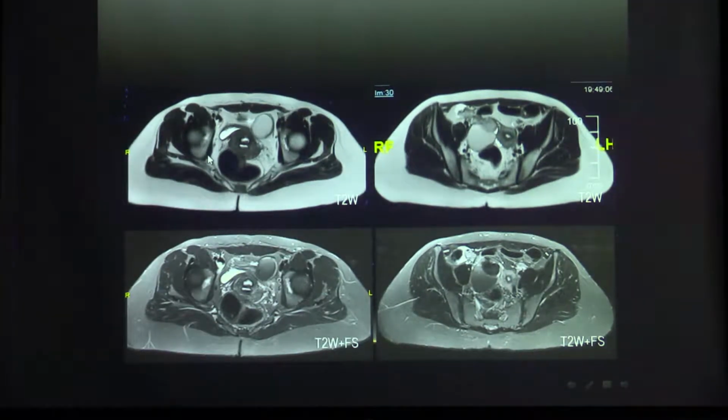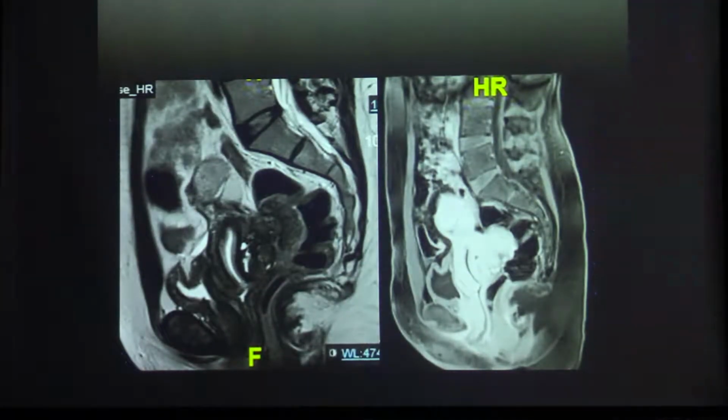We can see the endometriotic implant here. We're about to see a better picture of it. Note the high signal lesion in the posterior myometrium. We will get to it later. Those are sagittal views of the T2 sequences. Here we can see very clearly the endometriotic implant: bowing of the rectum, tethering of the uterus, thickening of the ligaments, and some high signal foci inside. Here, the same lesion after contrast enhancement. We'll see this picture again later.